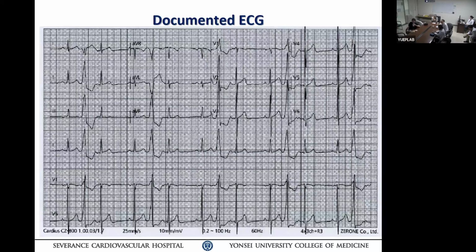So you measure the PP interval, okay, from the sinus P to the following QRS, P and then the next P. Then you have to answer that question. That to the next P. Yeah, that interval. Between the two, are they the same, or is it pushed forward? What do you think? Looks like the P following the PVC has a slightly shorter PP interval than the one following a normal P.